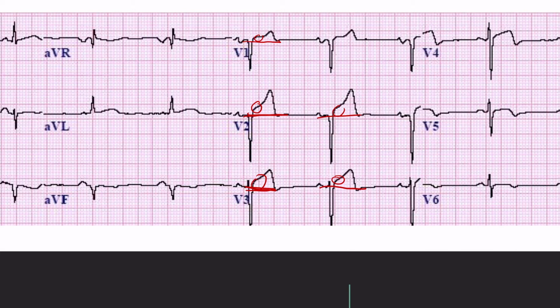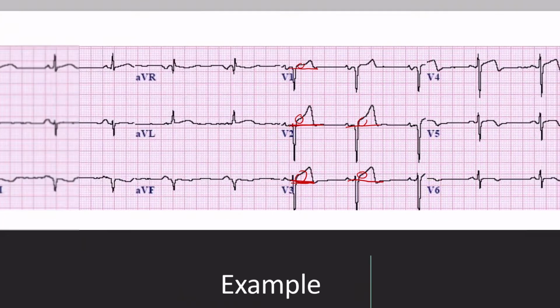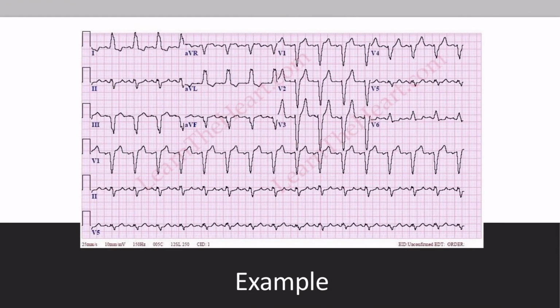So, like I said, you'll often see the ST segment elevation. And it's other modalities that are going to help you distinguish this from a myocardial infarction. In this example here, you can also see another finding that often goes along with this. So a left bundle branch block.